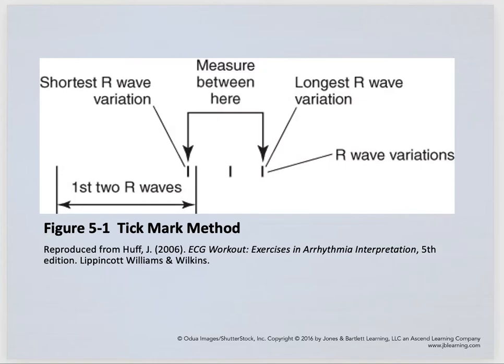So we've got a tick mark, right? Where the R wave falls, you're looking at the timing between the variation. When we're in class, it's a little easier than doing it remote, but I always say you're kind of eyeballing the spikes, the R to R intervals, and looking for any of that irregularity.